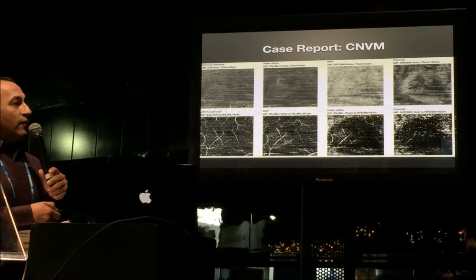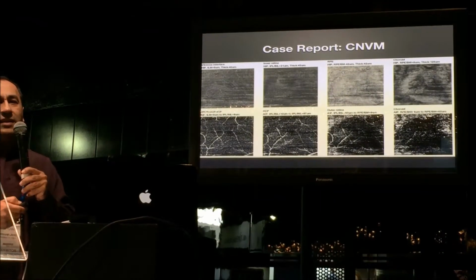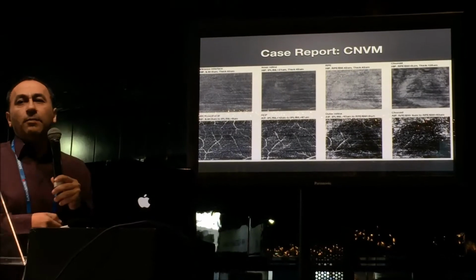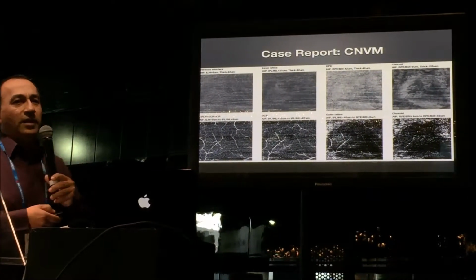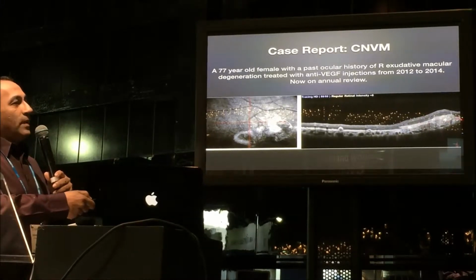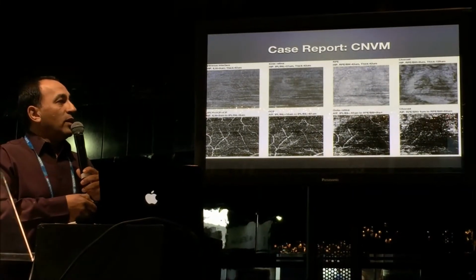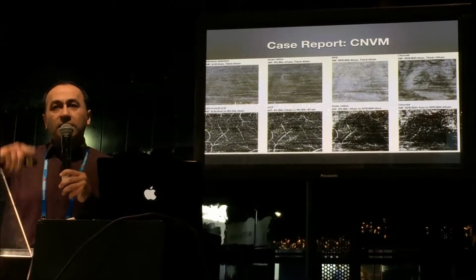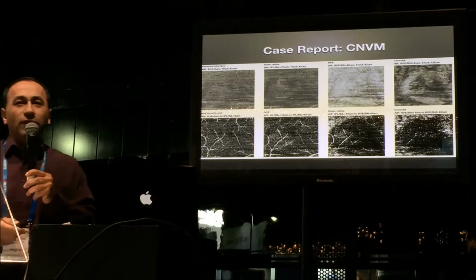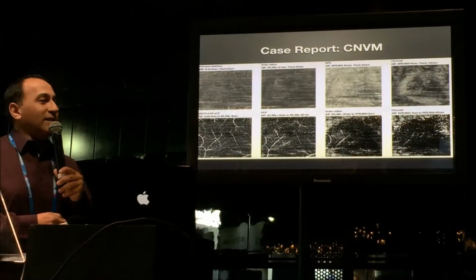The only concern I have with these scans is that when you've got a disorganized retina, how accurate is the OCT at finding where Bruch's membrane is when there's no Bruch's membrane? So, you know, you can see that membrane's pushed up, everything's disorganized in that area. So what I did was I went through and adjusted those thickness layers to have a look through different layers of the choroid and found no vessels in that area. So I was quite confident that it's a quiet neovascular membrane.